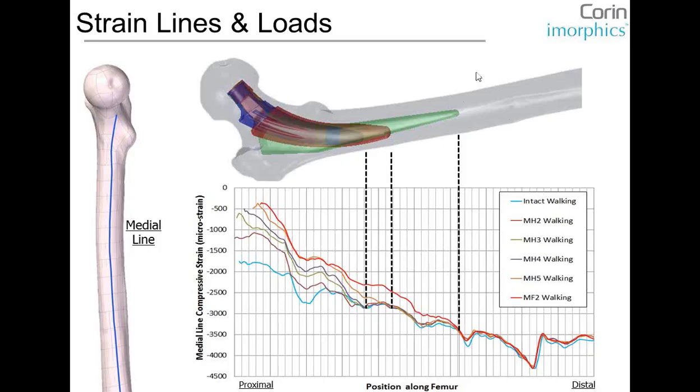If the surgeon doesn't put the implant in the right position, or malpositions the implant, you get a very different response. So this black line overlaid on the graph seen earlier is basically the mini-hip size 2 malpositioned by the surgeon. And as you can see, it has diverged away from the original brown line, which is the ideal location in the surgery, and it's even further away than the blue line.